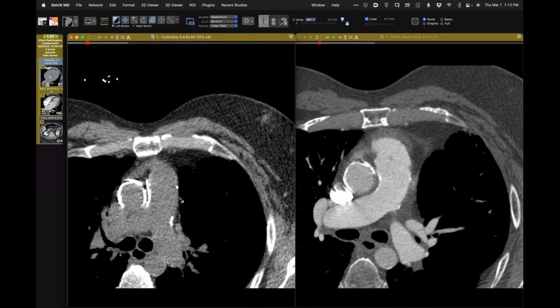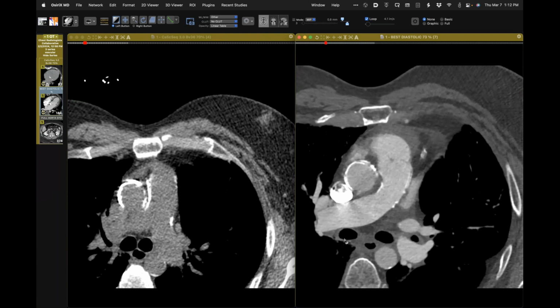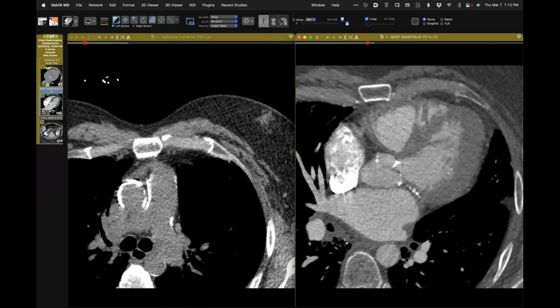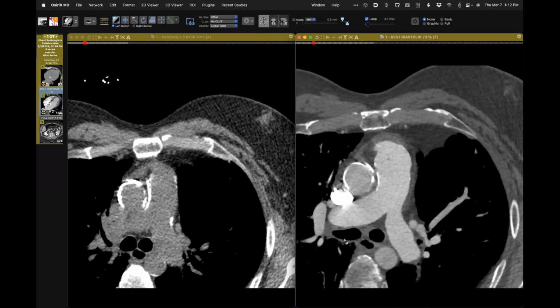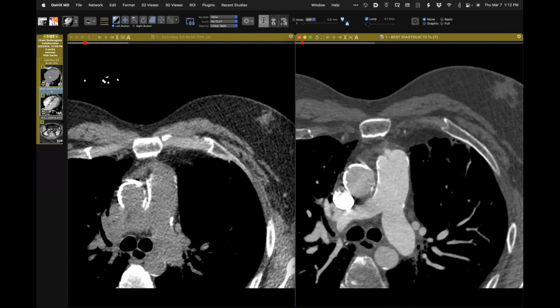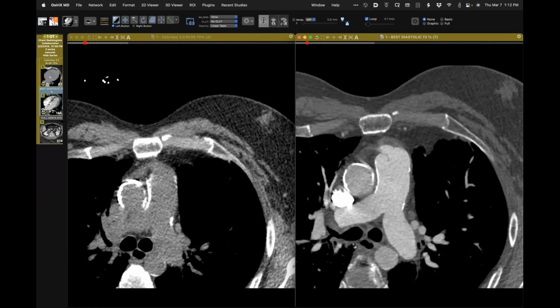And notice that they're really just located here and are not located more distally in the left or right pulmonary arteries and more distally going into the lungs. So I thought, whoa, that's really an interesting pattern of calcification. So I had to scratch around a bit, and I'll tell you that in a moment. But any thoughts from anyone about those calcifications?